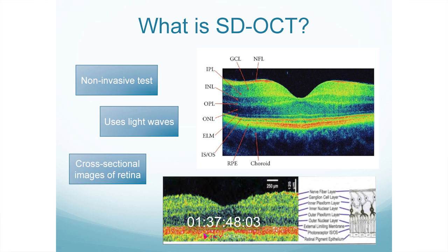You can see them side by side, and you can always refer back to an abnormal area on the OCT and look at it histologically to see where it's occurring. I want to emphasize one more point on this slide. The ganglion cell complex is a very hot topic in all types of eye disease, but especially in neuroophthalmology, because the ganglion cell complex houses the ganglion cells, which feed the optic nerve. So any abnormality to the ganglion cells could essentially result in a problem of the optic nerve. And we're going to go into more detail on that, but I wanted you to see here the ganglion cell complex and how it later on is going to affect the optic nerve, abnormalities of it.